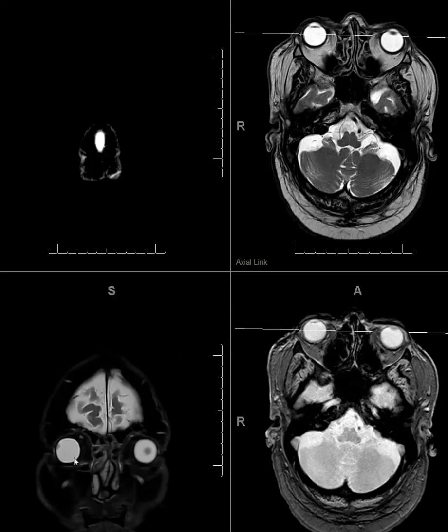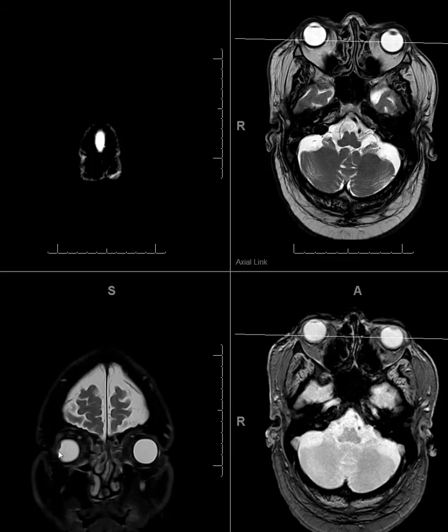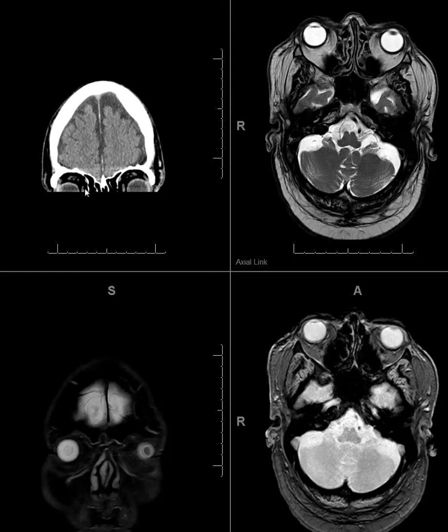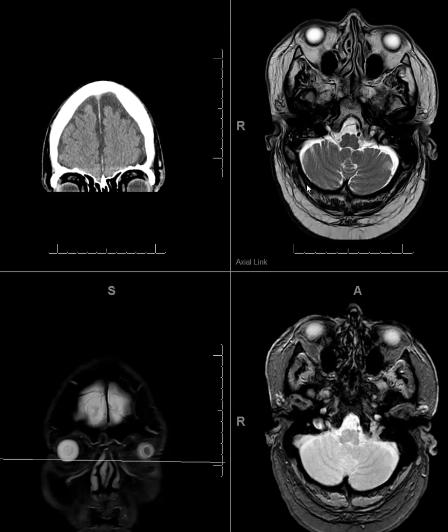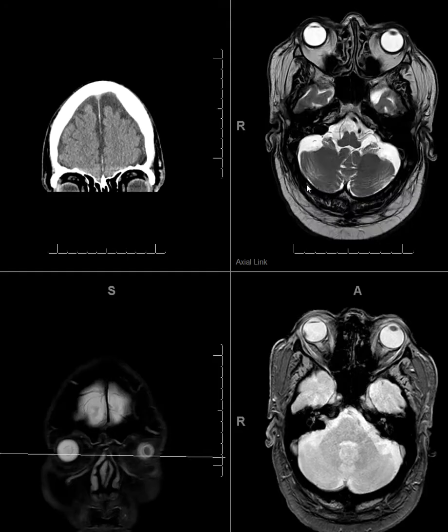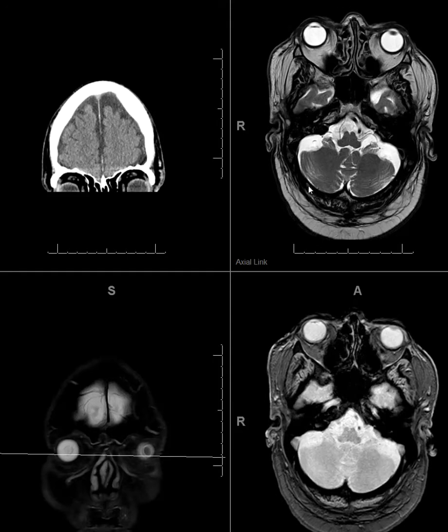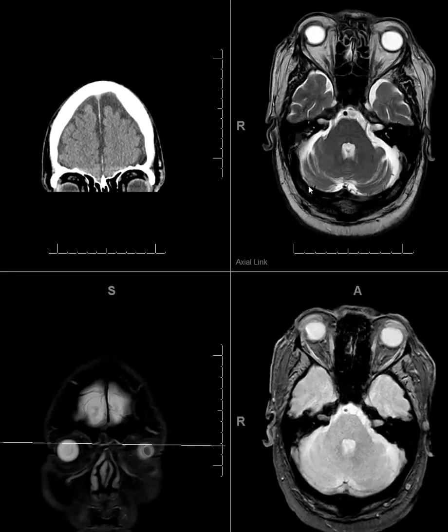On the coronal picture, you can see there's a little bit of lesion in the superolateral aspect of the right eye globe. Similarly on CT, it's hard to see. It's just an incidental finding, so always look at the eye globe to find out any subtle lesions.